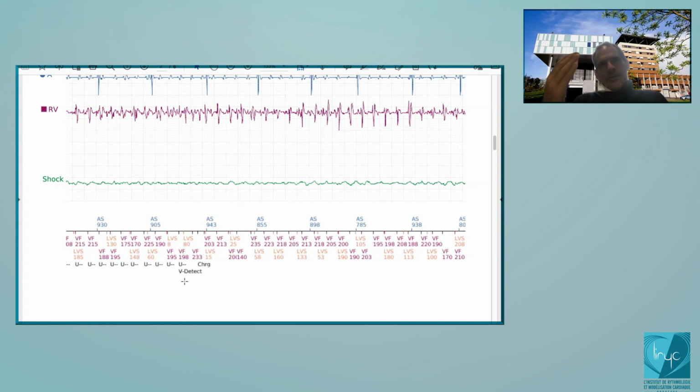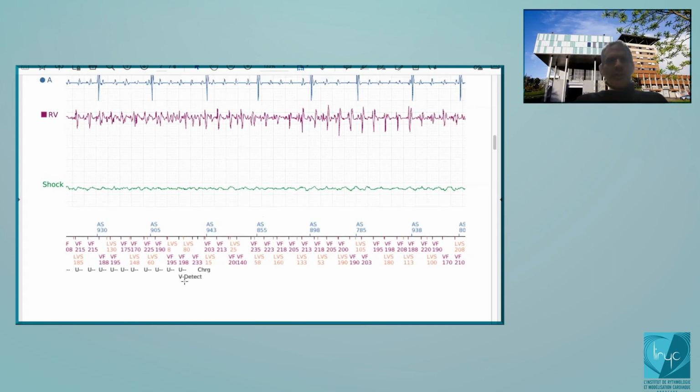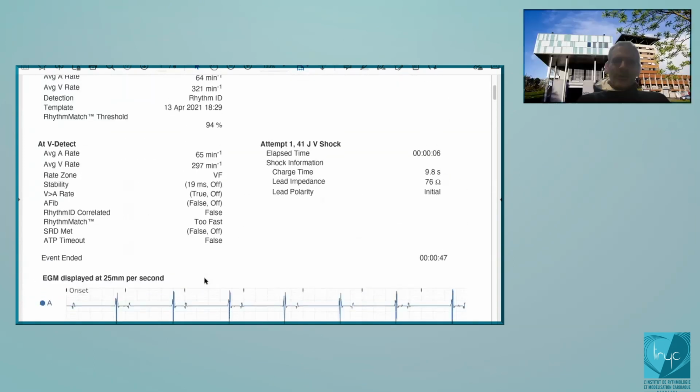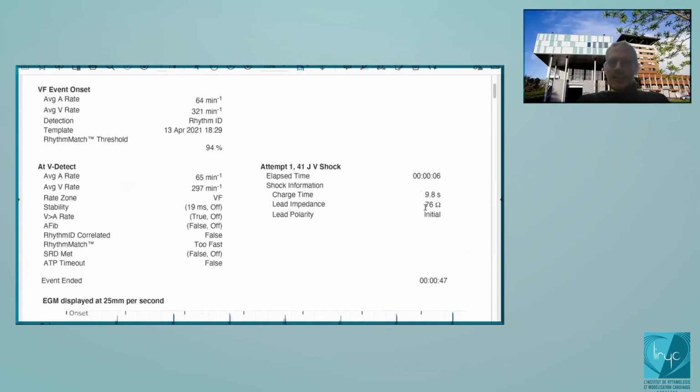But all the different studies have demonstrated that there is a huge advantage to prolong this duration. So it's going to be 2 plus 5, 7 seconds. Then the charge, how long? I would say 10 seconds, something like that. This is not an idea, you need to have a look exactly. Okay, charge time is 10 seconds.